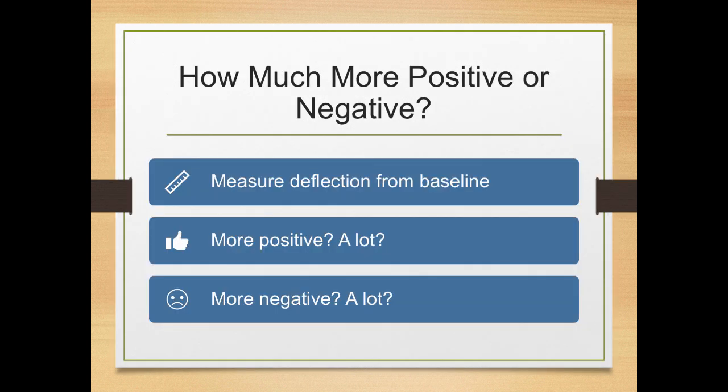And we're taking this isoelectric lead, that one lead that you took out and said that's the teeny tiniest, cutest little complex that I've ever seen on this EKG, and that thick blue line that you chose is that lead, and you're looking at deflection from the baseline.